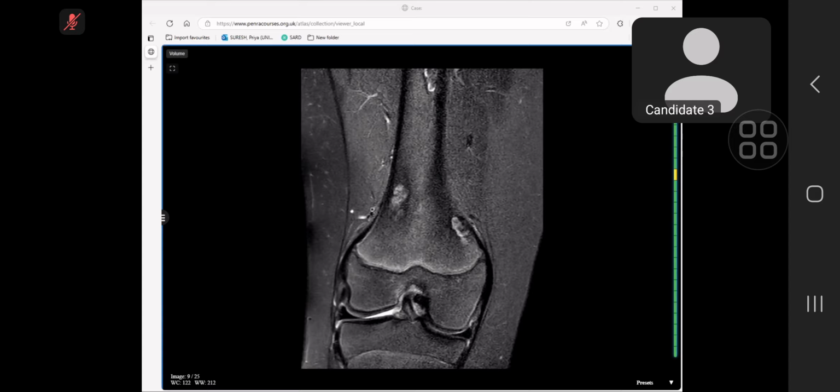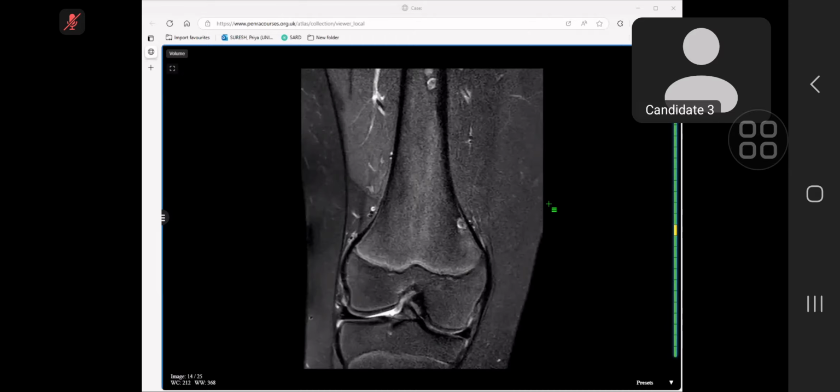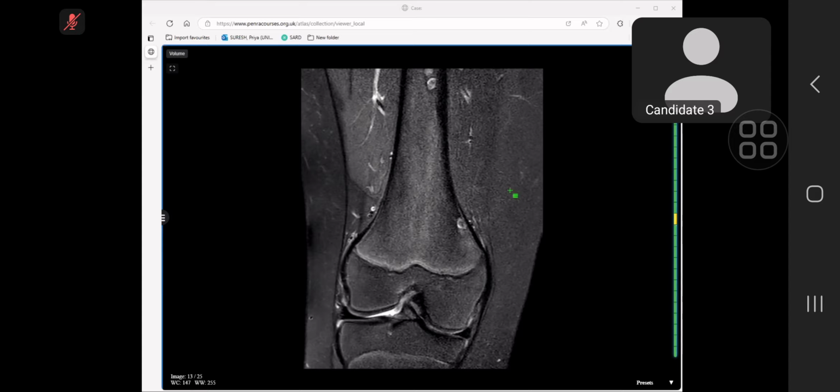So brown tumor is not a diagnosis in this case. There is a third lesion also noted along the medial diaphysis of the femur as well. So I would like to ask if there is history of any skin lesions, as I cannot appreciate any skin lesion on this MR. These are associated with neurofibromatosis, multiple non-ossifying fibromas.